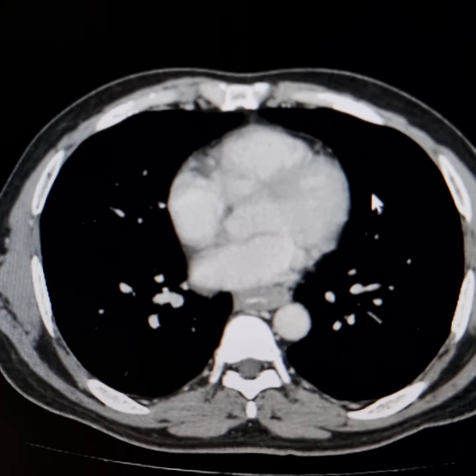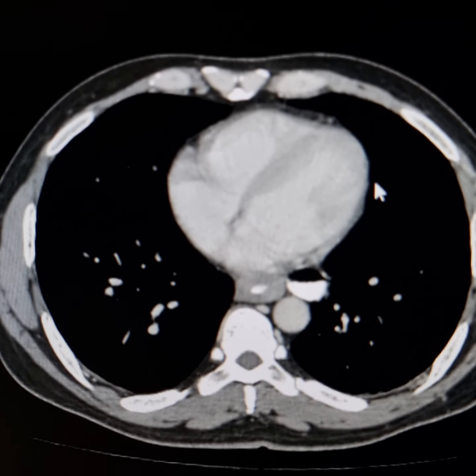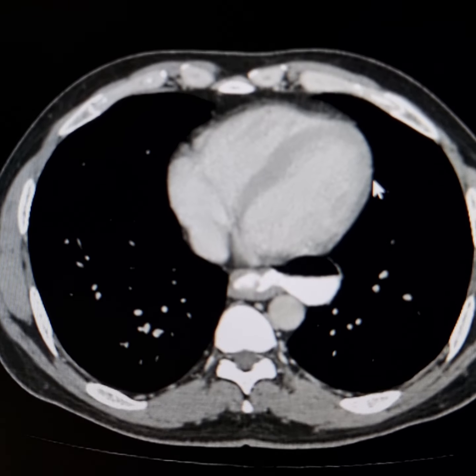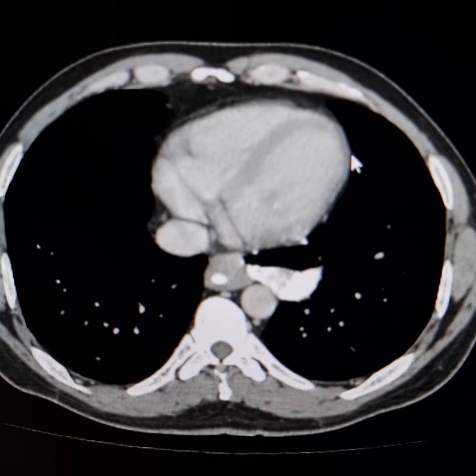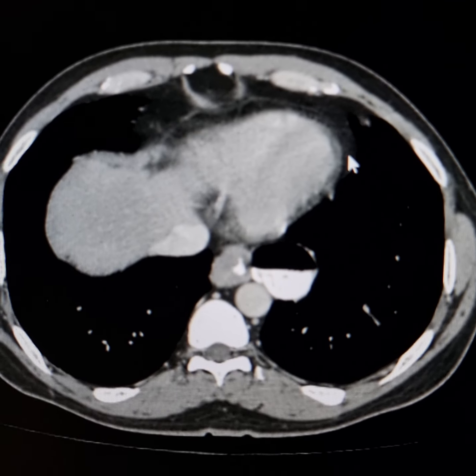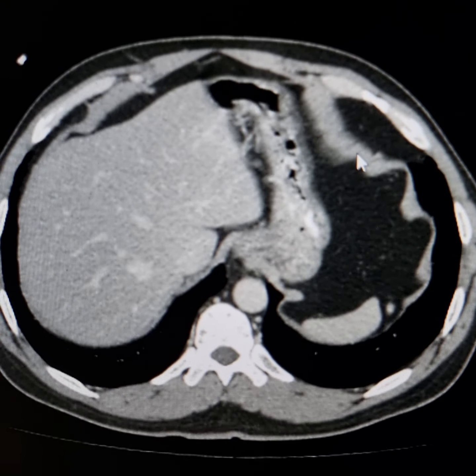Apart from the endoscopy findings, this may represent recurrent inflammation and associated thickening of the wall of the esophagus. Since there was no inflammation on the endoscopy findings, the possibility of achalasia cardia may be considered, although the segment is quite long.